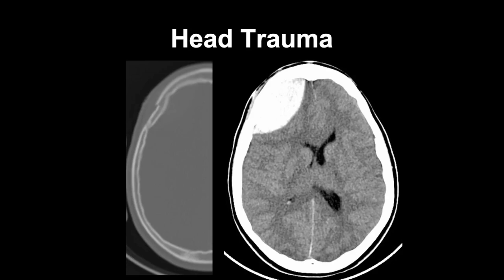We can see also that epidural hematoma can extend along or across dural attachments. We'll see it's different when we come to subdural hematomas in a bit. On the other hand, epidural hematomas cannot cross sutures, and typically, for instance, this hematoma here is contained by the coronal suture.